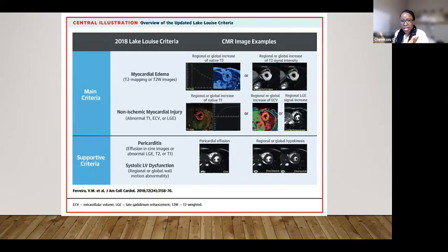Now, myocardial injury heals by scar formation, basically, either diffuse interstitial scar, fibrils within the myocardium, or complete replacement fibrosis, where there's been myocyte death and the myocytes go away and are replaced by collagen bundles and scars that form a distinct scar. Now, we can test that with T1 mapping or T1 weighted images, ECV assessment, and late gadolinium enhancement.